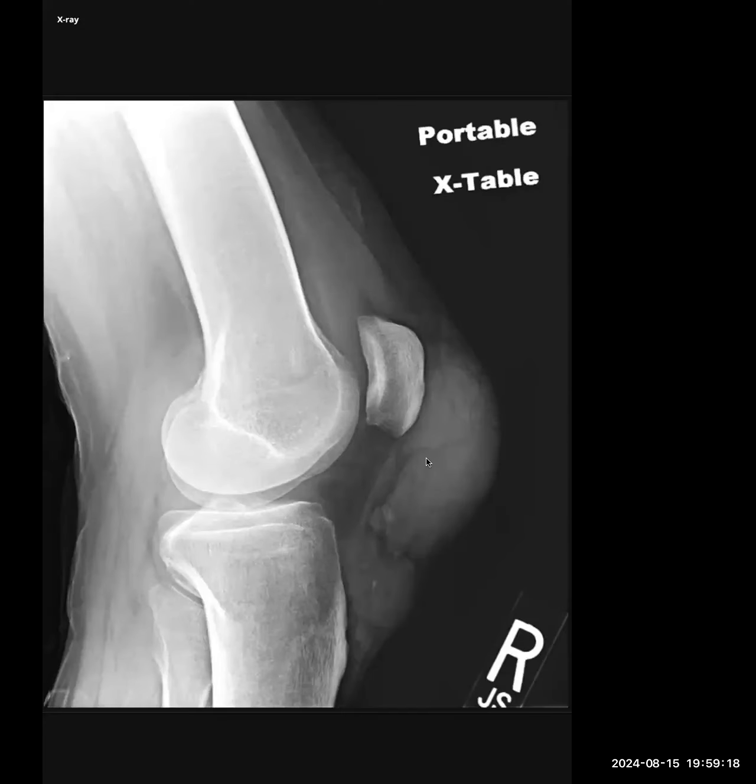In this, you described this as a soft tissue swelling, but I wanted to see if you could use the correct terminology. When you see these, always talk about how dense they are, even in the soft tissue compared to the other soft tissue. This is a good learning case, because gout, when they present with these tophaceous, almost mass-like lesions, have these densities, which is quite dense. This is hyperdense compared to the other soft tissues. So you eventually got to the diagnosis of crystalline disease, but you needed significant help along the way.